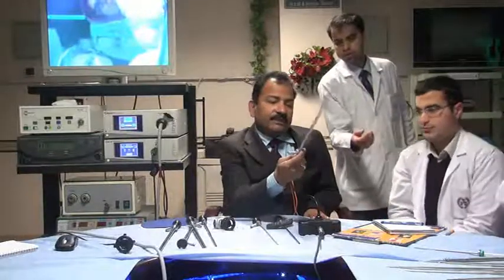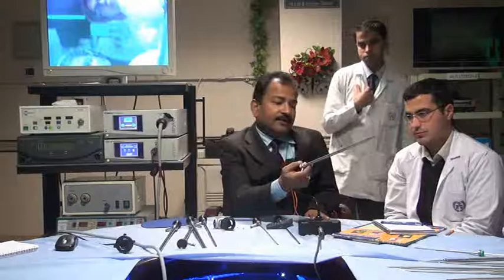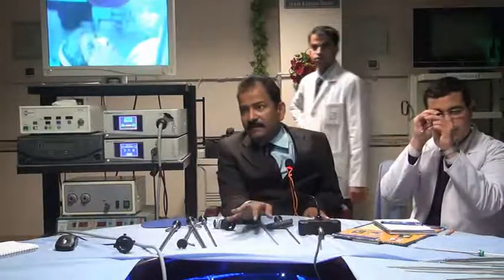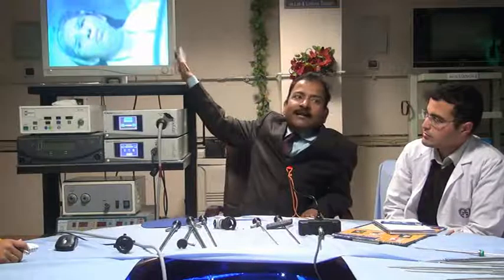This is your full HD, like it is written here. You see, this is an HD telescope. So whether it's an HD camera, will they always provide an HD telescope? No, it is not HD. Actually they are writing HD, but it is wrong, because it is optics. In optics there is no electronic circuit, it is a lens. But because of high definition and good quality, they are giving the name HD. So it is excused, but actually the HD term is only for camera and monitor, not for telescope.